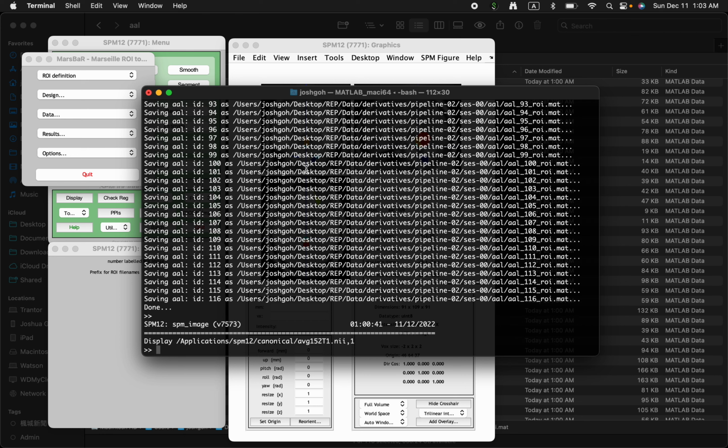Going to show you how to use another nice tool to easily make nice looking brain contrast overlays for figures that you might want to use in your manuscript. You can use MRICroGL as I showed you before, or you could use SPM12. You could do your settings in those softwares and then take snapshots.